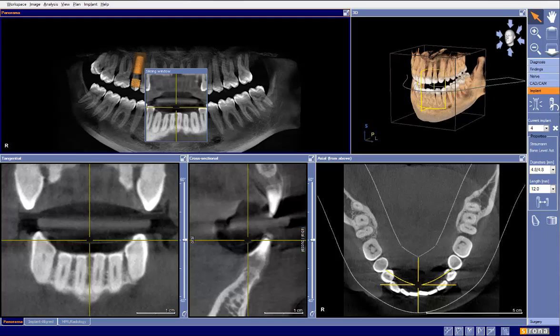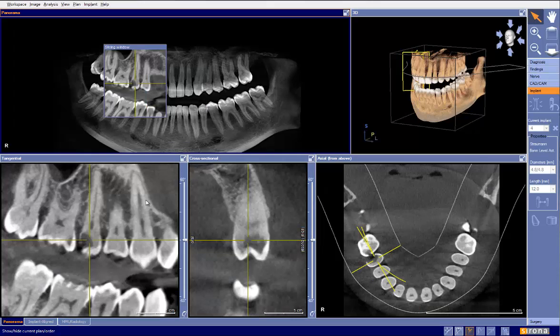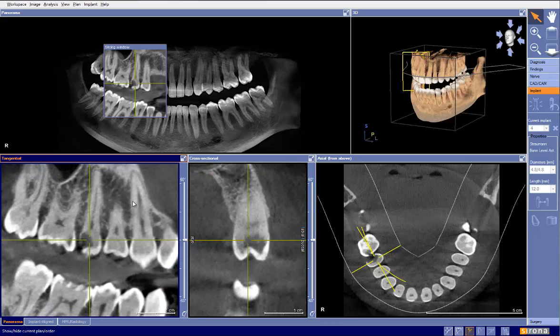Okay, this case has been sent to us to evaluate the suitability for implant placement in site number 4 using an immediate technique. Let's take a look, and I think we would all agree that the restorability of tooth number 4 is questionable, and that loss of the tooth is a very reasonable and expected thing. Now, of course, we can do endo, post-core, crown lengthening, full coverage restoration to try and salvage this tooth. But again, the submitting dentist has deemed this tooth not savable.